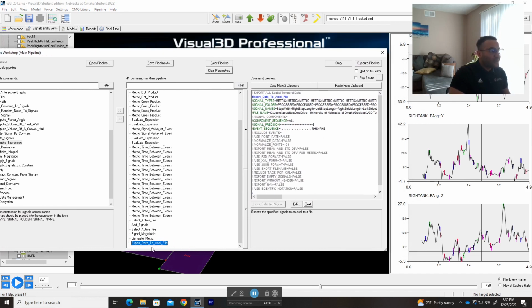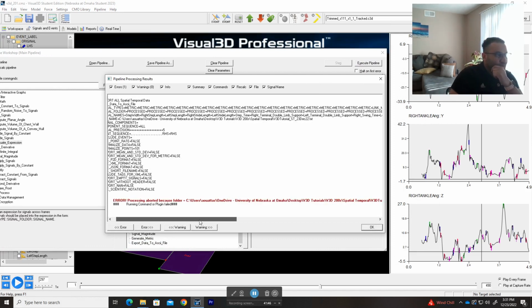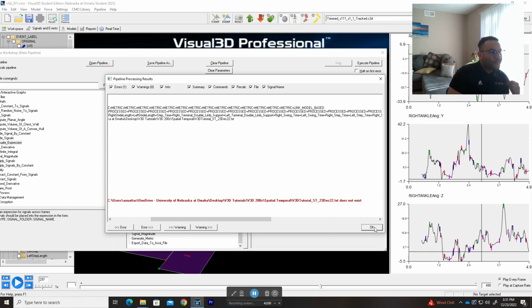So here, we go back to the export. We have all of those. Then we step again, processing aborted because folder. There's Spatial Temporal there, I didn't see that.